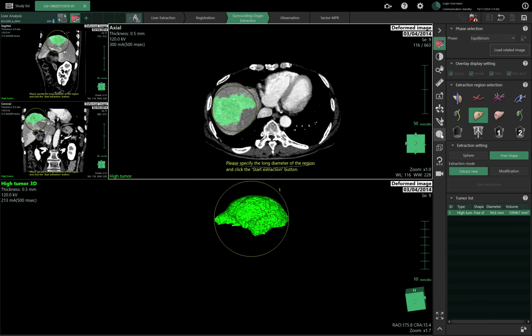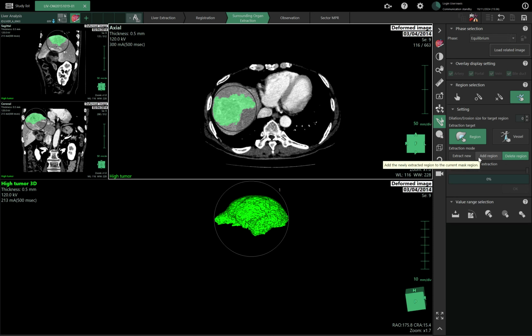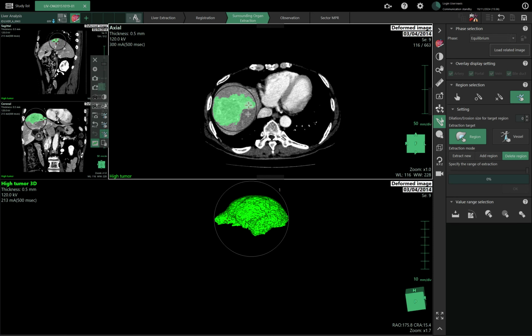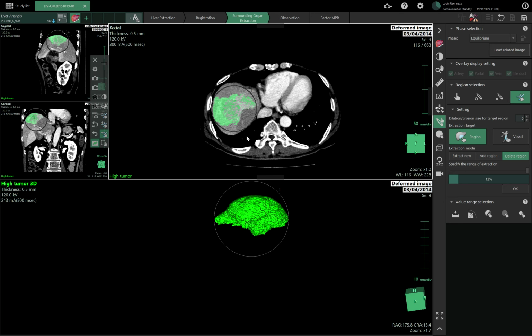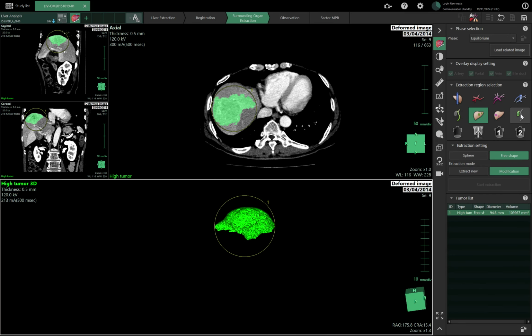I have this. We have selected this, and then I can delete. That's fine. Oh no, now it's doing... Okay. I don't know why it didn't before, but now it's working. Okay. Of course, with the undo button, I can just go back the last steps to undo the modifications.